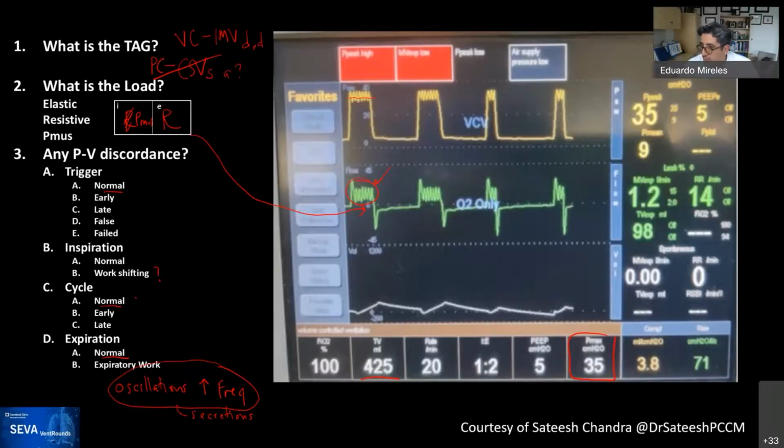Yes, Pink. The mode is volume control ventilation. It says down here, VCV. It says right on the screen. Right. And so Ivor just sent us the PDF for the ventilator. Cool. Thank you. Yeah. So this is the GE one, right? Yeah, it's not readily available to us, but they're using the Engstrom name as a marketing thing. Okay, so that's why I said the GE CareScape that we have now was the upgraded Engstrom Carestation, which is what you're showing here.